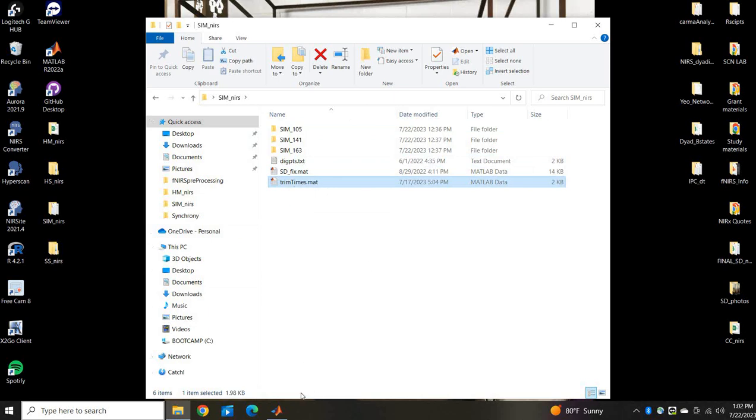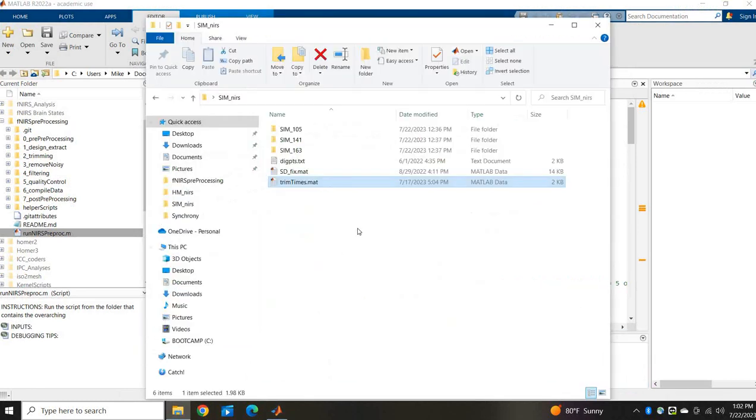In the previous one, I trimmed with the first trigger, but you can also trim with a .mat file or a .csv. Let's say I wasn't sure if all the triggers were there or correct, or something happened in data collection where the triggers are just wrong and I don't want to fix them all, but I have the correct times.